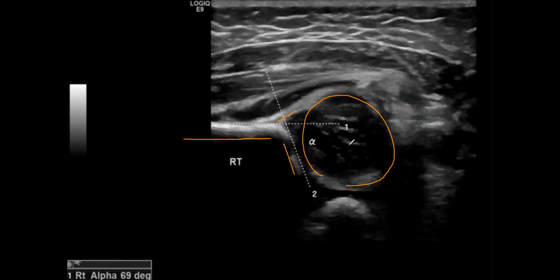Subjectively, the femoral head is rounded, with preserved shape, present normally in its socket. If we do a femoral coverage ratio, more than 50% of the femur is present in its socket. This is regarding the femoral epiphysis.